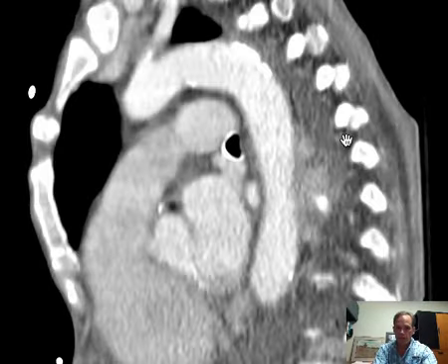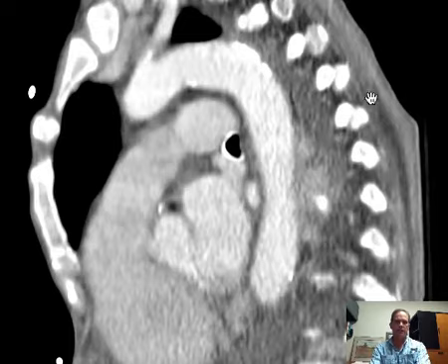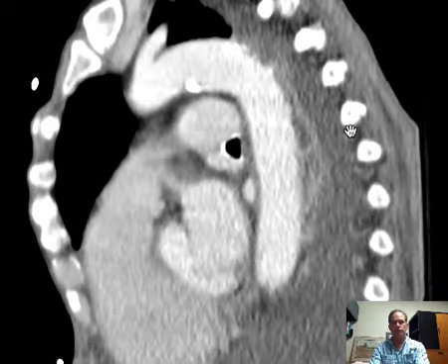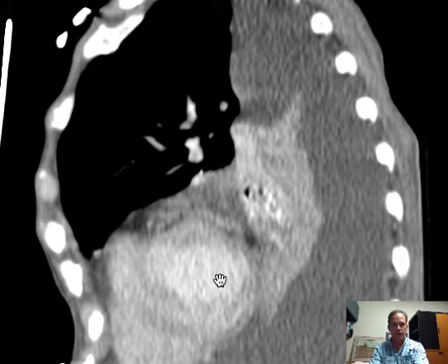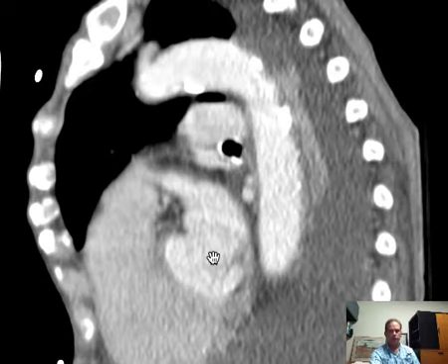So look at this. This will tie it together. If you can keep these things in mind, it's complicated, it's not intuitive, but you have the right ventricle, which, remember, is more anterior than the left ventricle. That's an important thing to remember. You know that the left ventricle is more leftward, but the right ventricle is more anterior and the left ventricle more posterior.